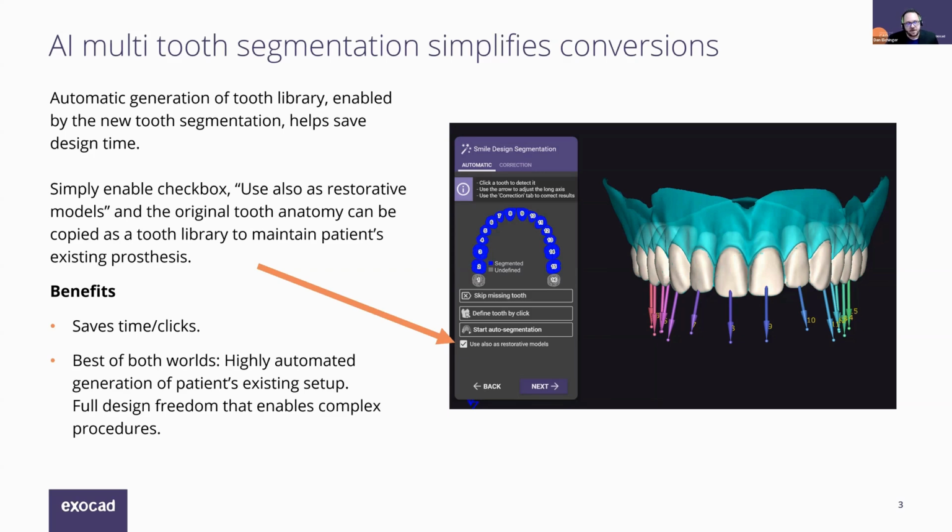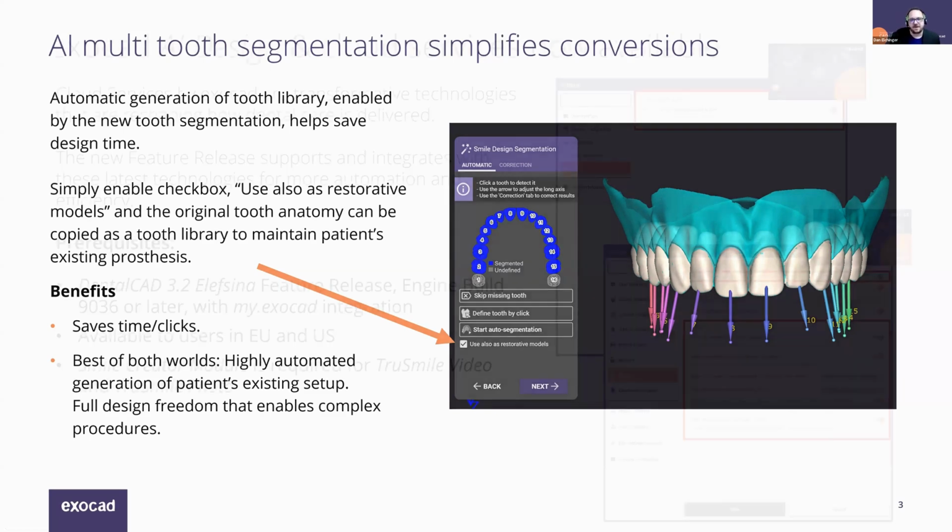When you utilize tooth segmentation on bite splints, it gives you an automatic proposal of the bite splint, and the margin line is defined for you. So anytime you're copying a pre-op, or in a bite splint workflow or duplicate dentures, I highly recommend utilizing this AI service. It's just a big time saver. So we'll go ahead and move forward.